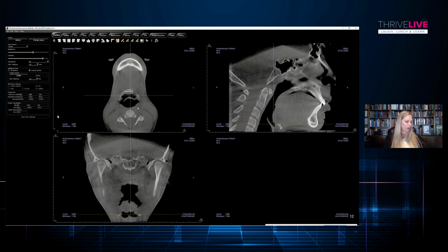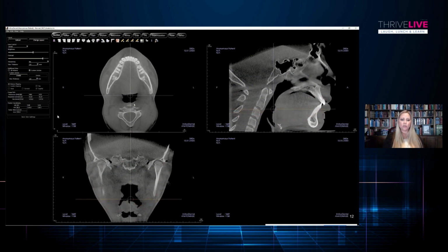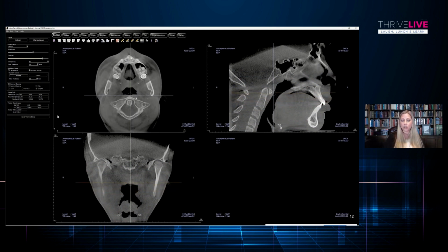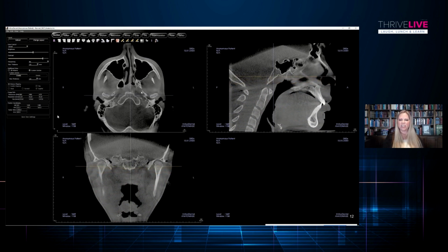This is the level where we might get calcified carotid atheromas. So you might look for that as well. As we go up the airway space, we can look, for instance, at a limited airway space. Patient might have enlarged tonsils, and all the way up to the nasopharyngeal region. Once we're in the nasopharyngeal region, we have the torus tubarius, and right behind that is the fossa of Rosenmuller. We want to make sure that that's pretty symmetrical and intact. We know things like to exist in this area, so we want to make sure it's fairly symmetrical.